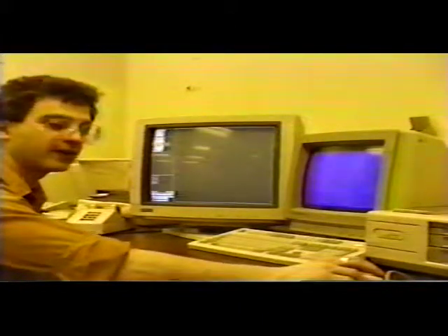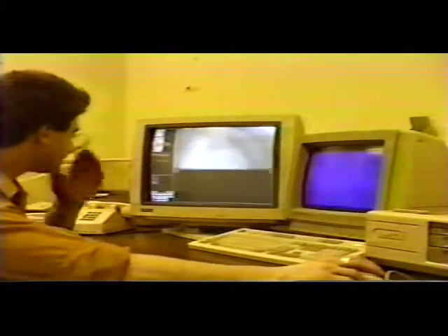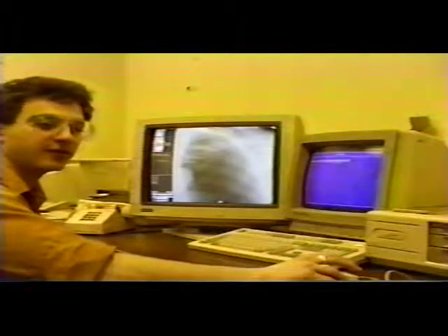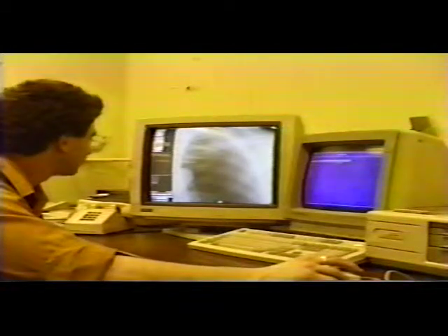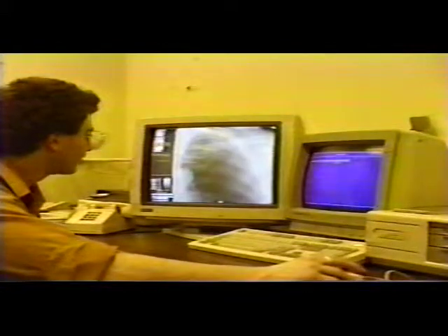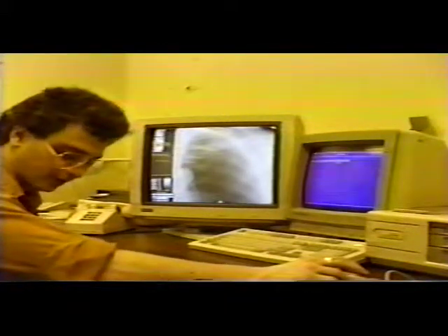A few chest scans. So I might want to see things black bone, or I might want to see things white bone. That's easy to do. And again, I can always adjust the contrast. It's a really fun thing to do, just see the positions when they come in here.